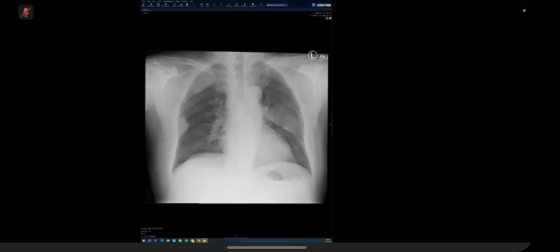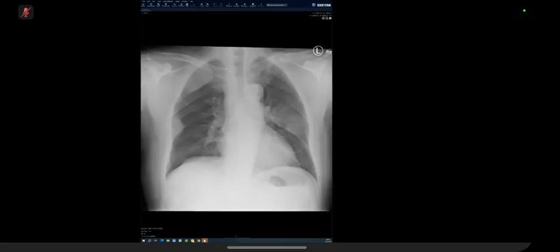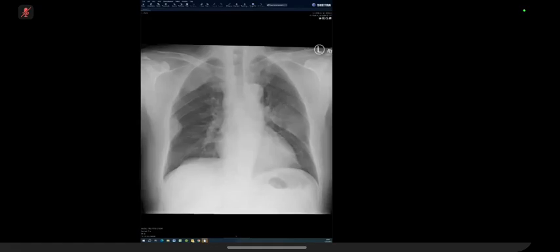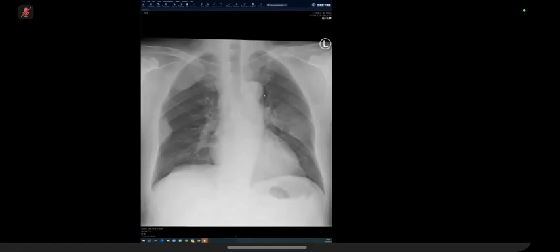Okay. So you mentioned these two, and the one in the left mid zone. And there's a right paramediastinal one as well. Apologies, this one, yeah, superior mediastinum. Okay. So you said no bone destruction. Do you want to think about that again and help me find the bone? Yes, the second rib is missing. So I suspect that there is destructive bone change. Also in the left mid-zone, there is an absence of the rib. They're suspicious of bony invasion.